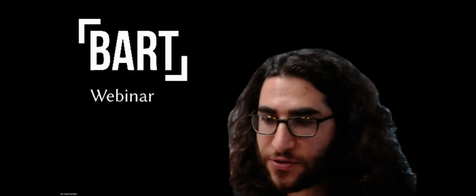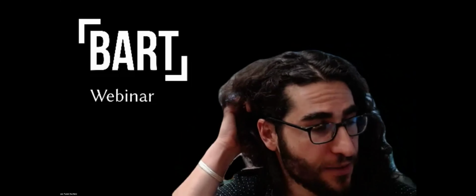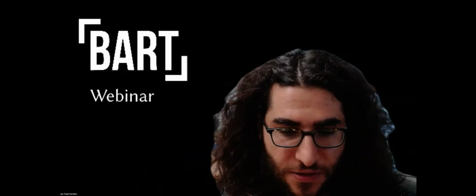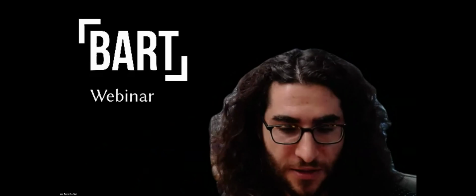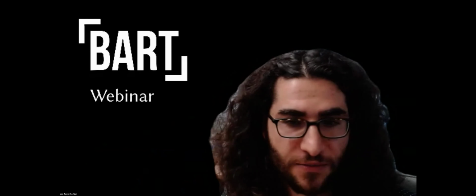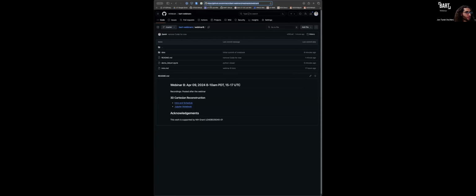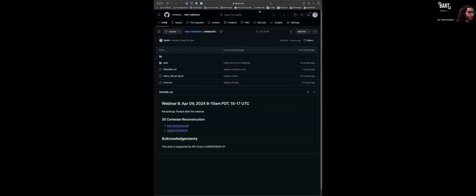I'll go ahead and share my screen. For this, I'm going to share my full desktop because I'm going to use some external tools outside of the notebook. So just let me know if it's too small. I'll start by sharing just a single browser. Can everyone see this okay? Yeah? Okay, great.